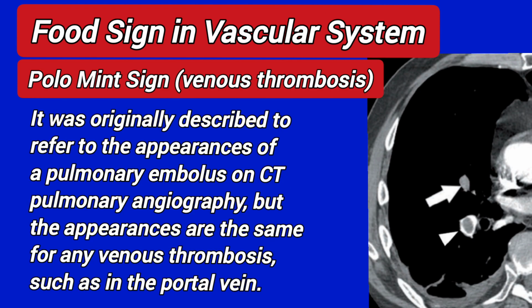It was originally described to refer to the appearances of a pulmonary embolus on CT pulmonary angiography, but the appearances are the same for any venous thrombosis, such as in the portal vein.